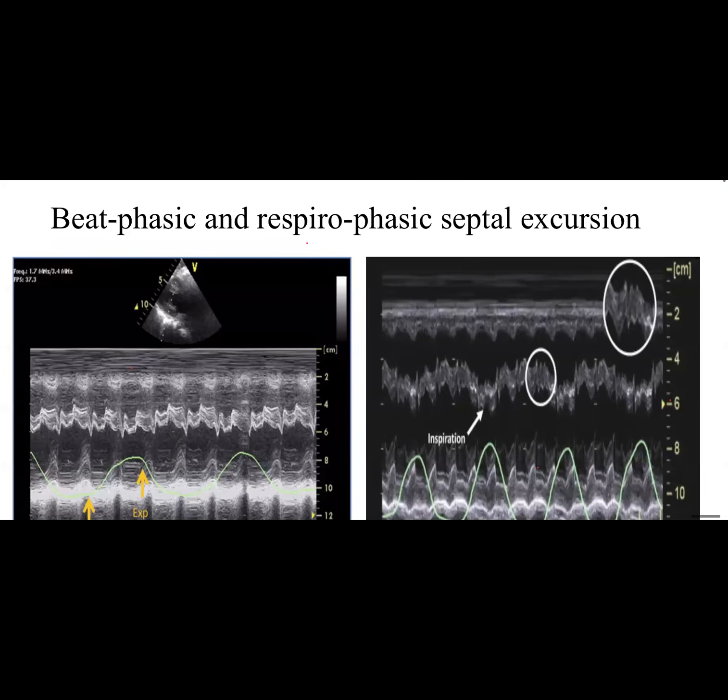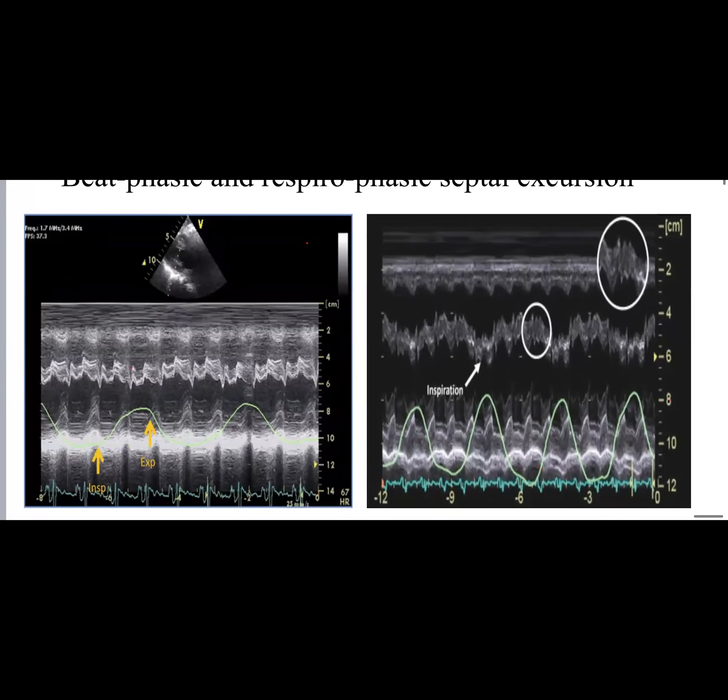Now, what do I see here? What is this? The one on the left, the one on the right. They are so different. Yes. What do you see?